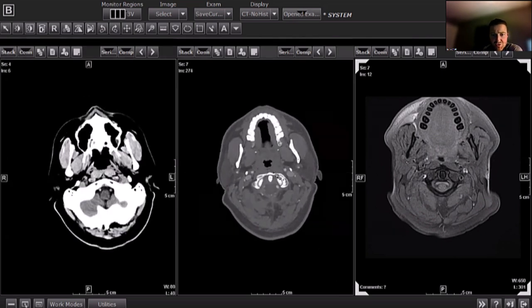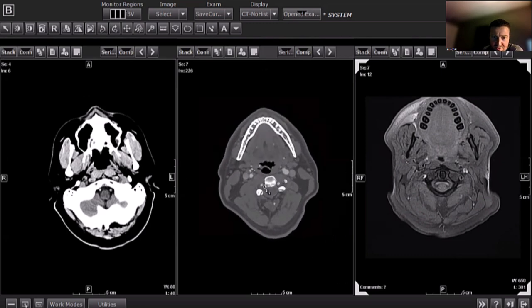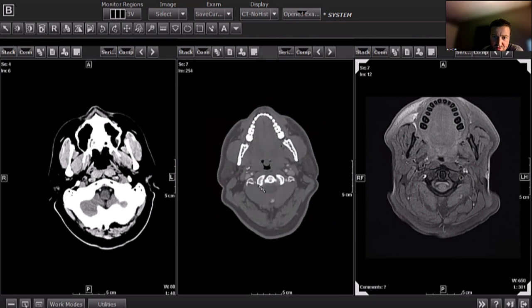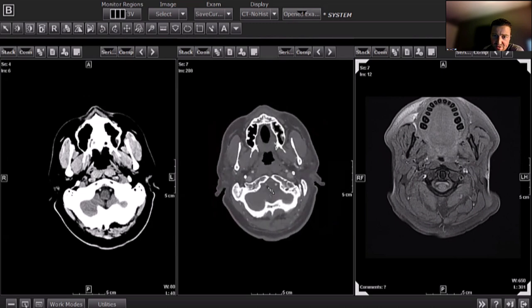On their CT angiogram, we'll just cut to the chase. The right vert is a relatively normal caliber at the distal V2 into the proximal V3, and then all of a sudden becomes narrowed in caliber, slightly irregular as well in the V4 segment, and narrowed.